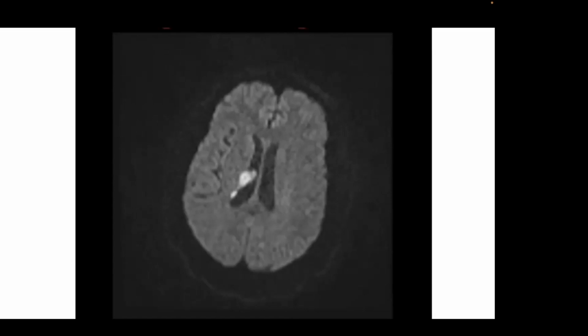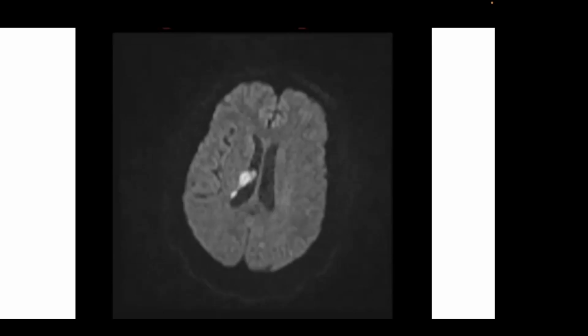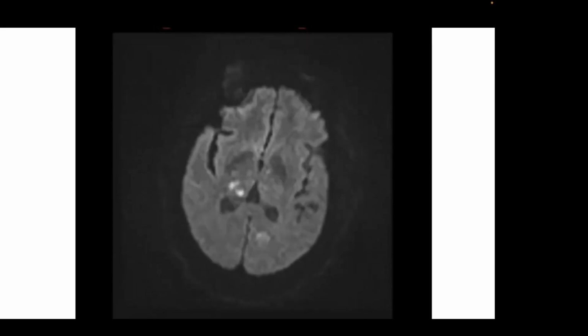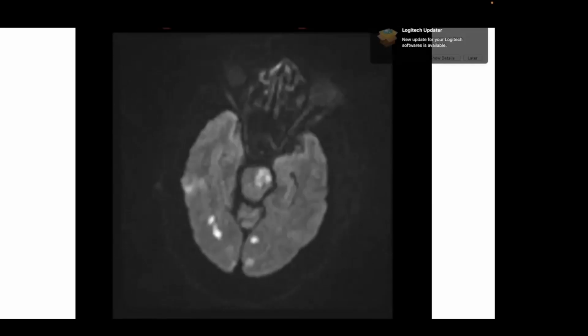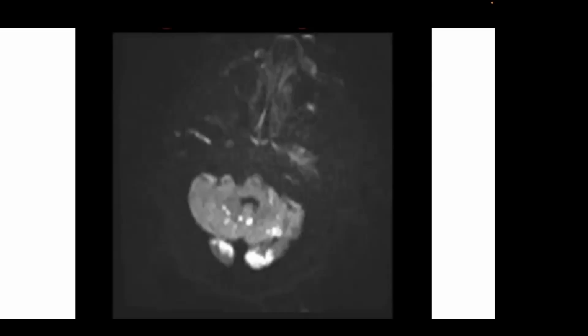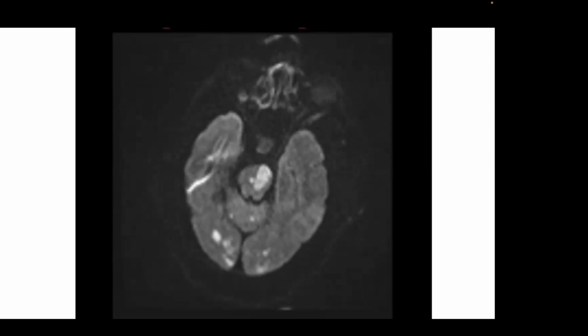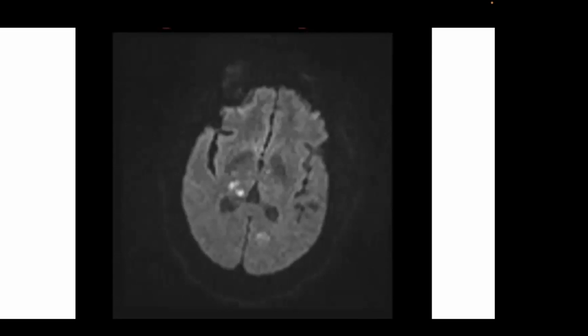So in this host of infarcts, you have to now decide, where do you think the lesion is? Well, there's not a single lesion that will give you this pattern of infarction. This is a patient with posterior circulation ischemia with multiple infarcts, but all arising, in this case, either from a proximal basilar lesion, which is embolized, or a vertebral embolization. So again, this is not uncommon in posterior circulation infarcts to see multiple infarcts.